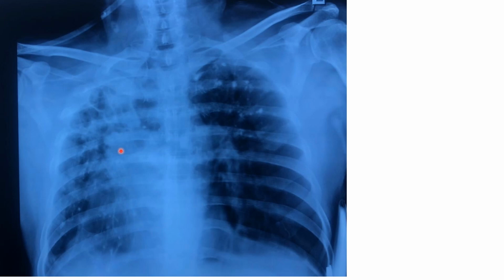Again, a similar X-ray. So here it's fibrosis, the trachea is shifted to the side, so you see that the lung volume is reduced. This diaphragm, this area is lifted. They say it is because of these fibrotic bands here, they're just getting pulled up. This is called the juxtaphrenic peak sign, that the tenting of the diaphragm is happening here.